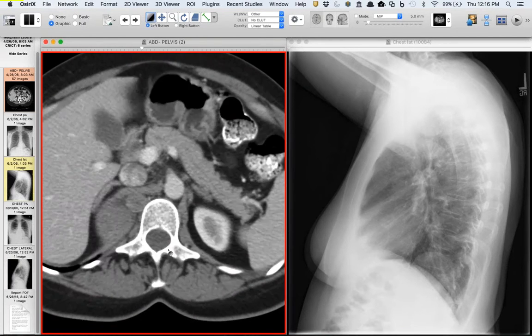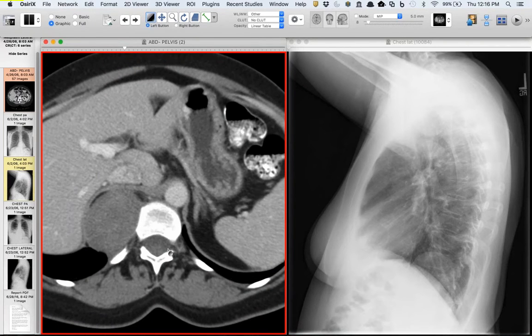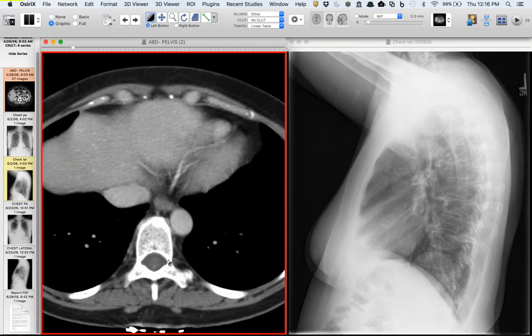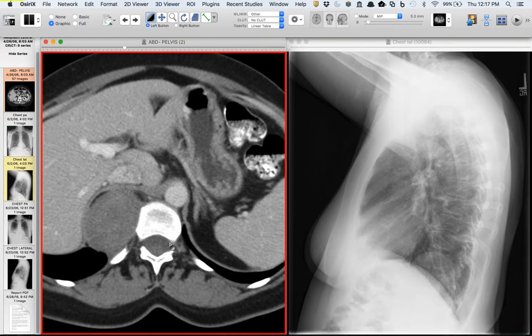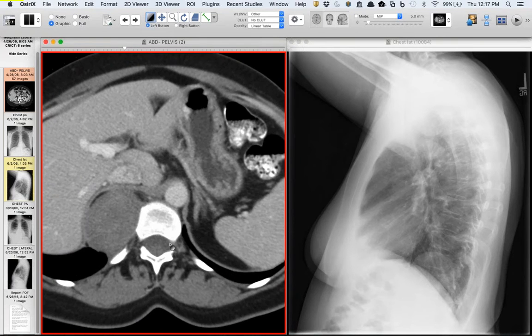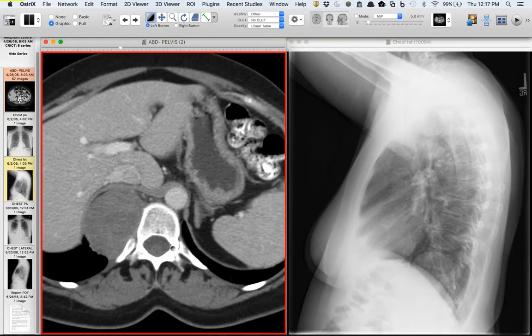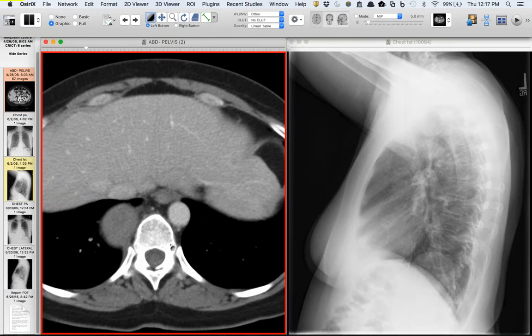Yeah, when you see things come up like that, or in that particular location, one should think of the so-called thoracoabdominal sign, like an abdominal process coming into the chest, could produce these kind of findings. So if you see it in that location on the frontal and the lateral projection, you think of processes that come from the abdomen to the chest, and there are three places. One is the medial, and the other is the lateral lumbocostal arches. But this one is really not one of those, but rather retrocrural by virtue of its location. So it's a variation of the theme, somewhat, of the thoracoabdominal sign, or it has some similarities to that. Right. Even though it isn't something that's primarily arising in the abdomen, for example, coming up into the chest. But things that do that can produce the same kind of thing on the frontal and lateral projection for sure.